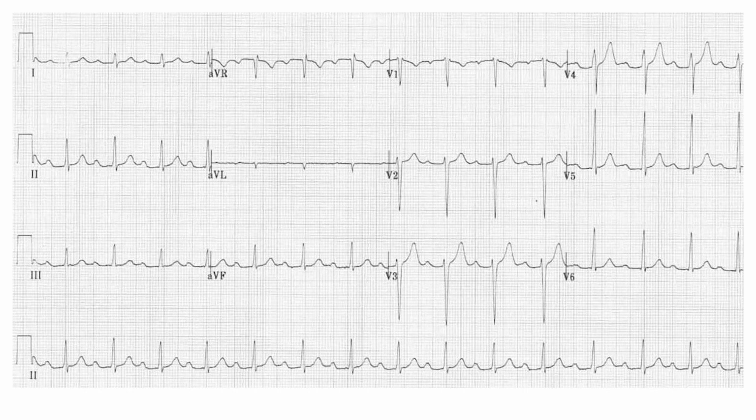Remember, now we have started studying the kinds of arrhythmia. Now these are bradyarrhythmias, and later we'll be studying the tachyarrhythmias. In the lectures before this, I have not focused much on the rhythm strip. I have mostly used the 12 lead ECG and shown the findings. But from now on, whenever we read about arrhythmias, be it brady or tachyarrhythmias, the rhythm strip is very important to look at. The rhythm strip will always be at the bottom of the 12 lead ECG, so always look at it to find out the arrhythmias. And I have already told you why lead 2 is known as the rhythm strip: the lead 2 vector is in accordance with the normal axis of the heart, around 60 degrees.